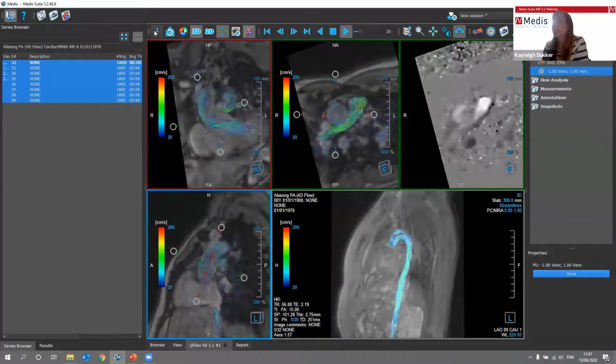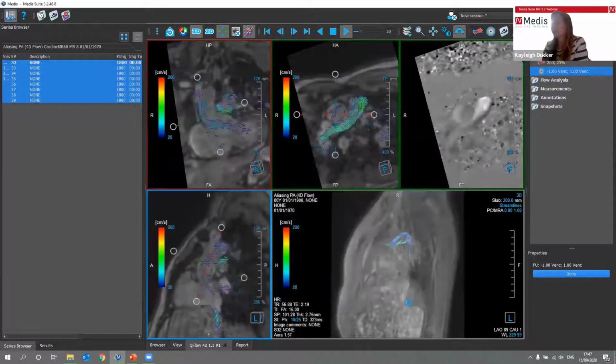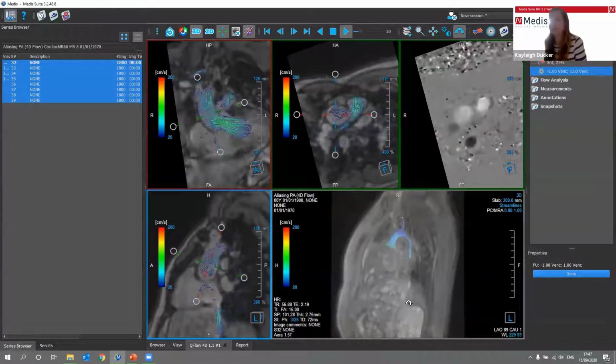So we can also set the level of background correction. And this will then also stay put for the next time. So next time it will by default do also the third degree for each of them.